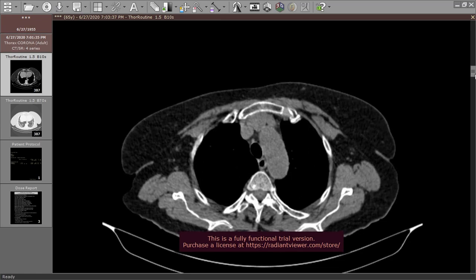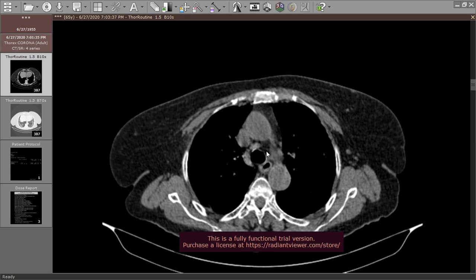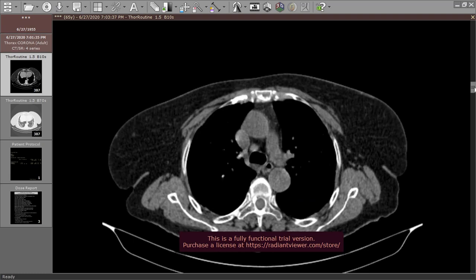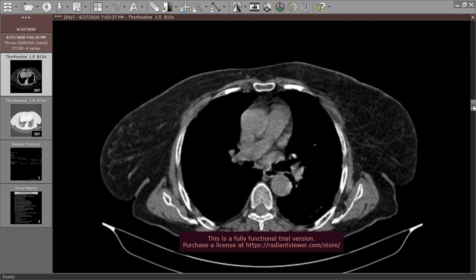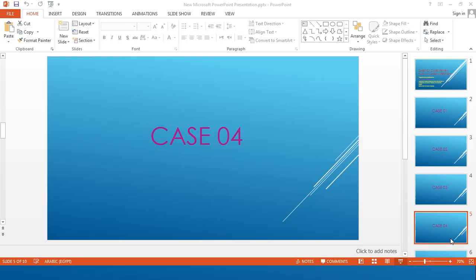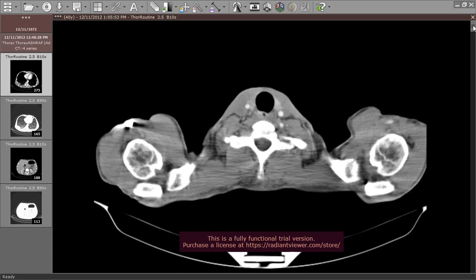Again, you can find lymph nodes, pretracheal lymph nodes, pretracheal retrocaval lymph nodes. This is a left paratracheal lymph node. Never say it is an aortopulmonary node, because if you take an axis passing by the ascending thoracic aorta and descending thoracic aorta, and you find this node on the right side, this is a left paratracheal node. If you find it on the left side, it would be an aortopulmonary node. Again, pretracheal nodes. Case number 4.